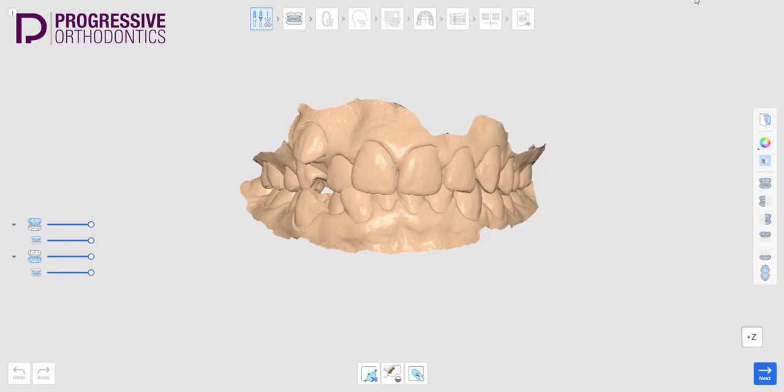This can easily be done chairside with a patient to discuss and plan orthodontic treatment or assist in planning implant or other prosthetic restorative treatment for a better orthodontic referral and better patient education. An STL file produced by any intraoral scanner can be used in the software. I'm going to give you a brief overview of how this tool works.